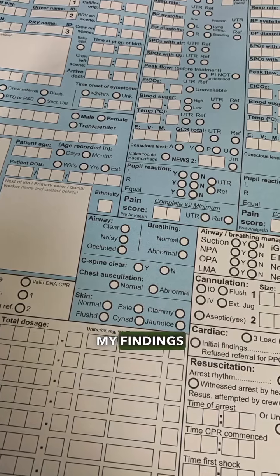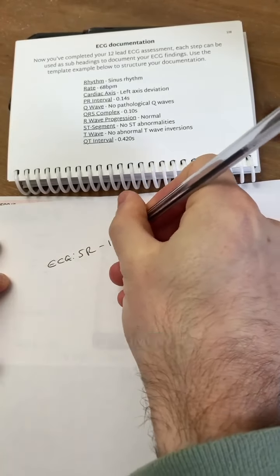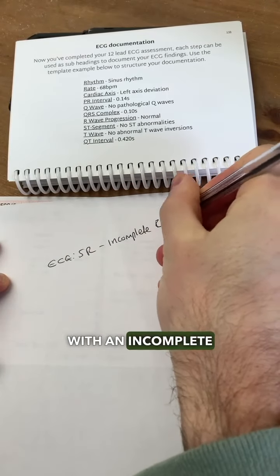before documenting my findings on my paperwork. For this ECG, I'd probably document it as sinus rhythm with an incomplete right bundle branch block.